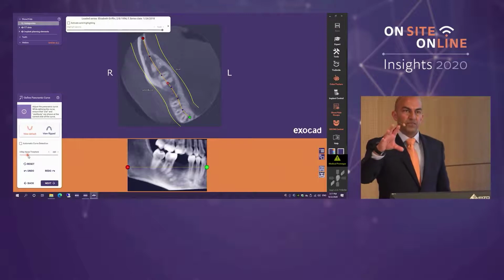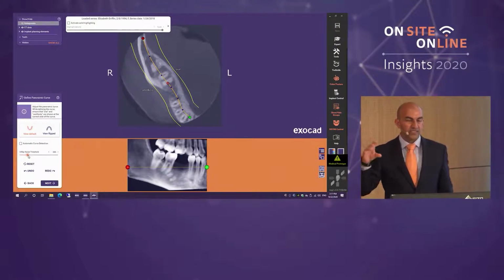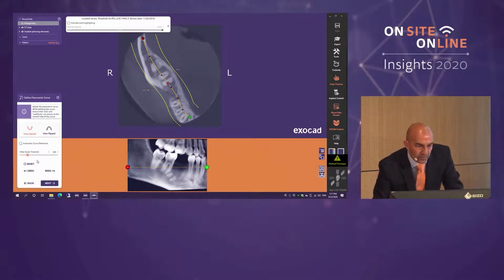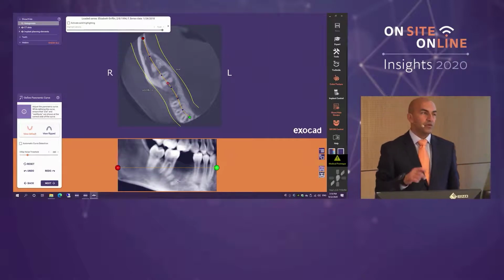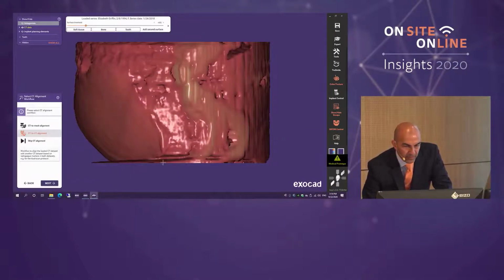So just to reiterate, this is not a periapical image. This is data from the CBCT that's been modified to make your planning easier, okay? For colleagues in the room that can see this, these in the lower jaw under her extraction site were actually osteophytes. We had this analyzed, and it was found that it was absolutely safe to place the implant in this particular area.